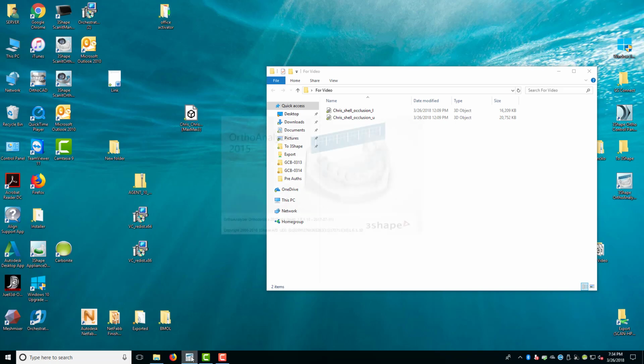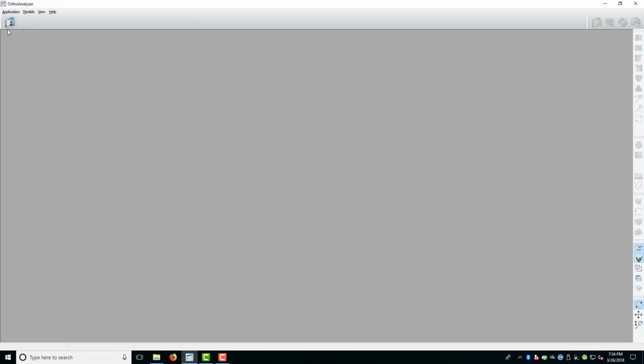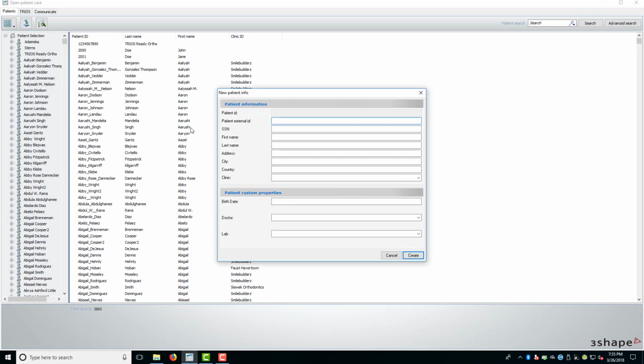And I'm waiting, and I'm waiting, and I'm waiting. There we go. It's popping up right now. So the first thing that I have to do is create a patient. I've used myself a lot of times. I'm going to do Chris and my alias Coffee Guy. And I got to do something there, and I'll show you why later on.